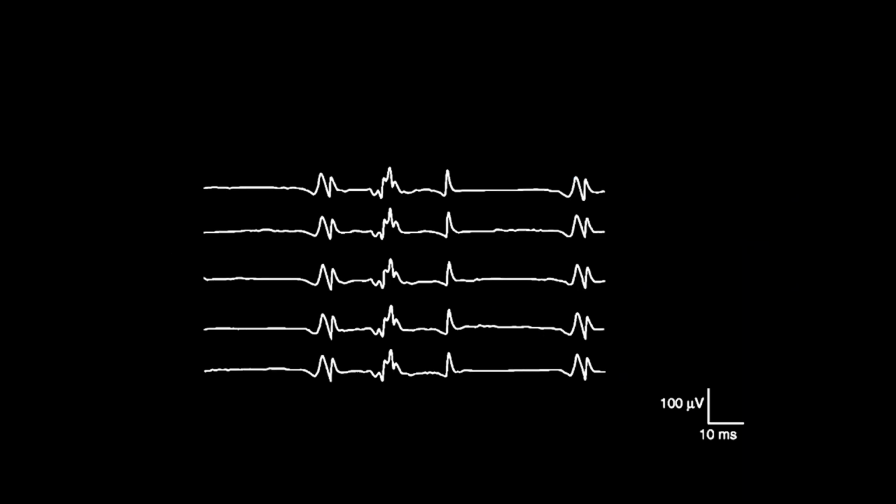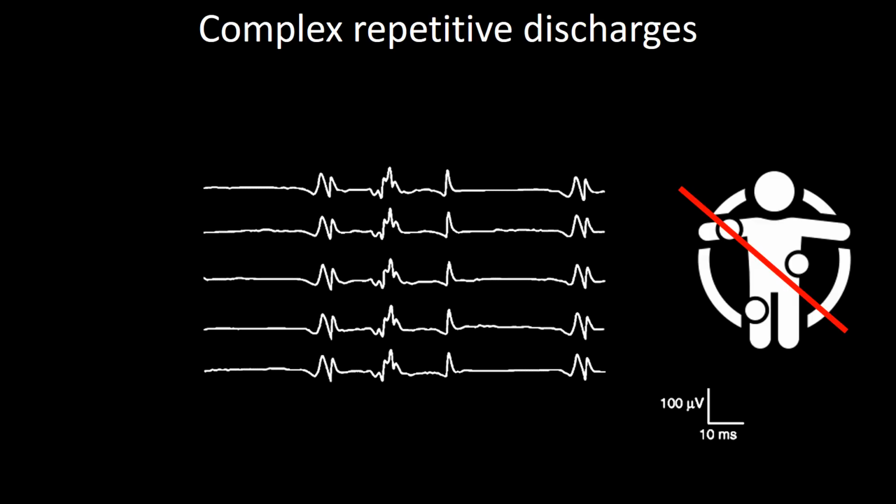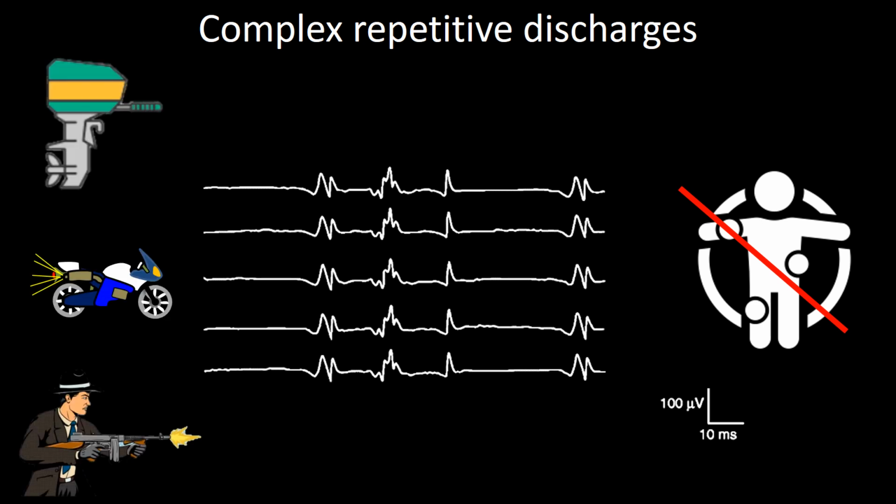The spontaneous activity presented in this question corresponds to complex repetitive discharge. Complex repetitive discharges are not associated with any clinical manifestation. The sound generated during EMG recording by this activity resembles the sound of a motor of a boat, an idling motorcycle, or the firing of a machine gun. This is so because of its repetitiveness and its abrupt starts and endings, as well as sudden drastic changes in the quality of the sound, as you will hear in the next frame.